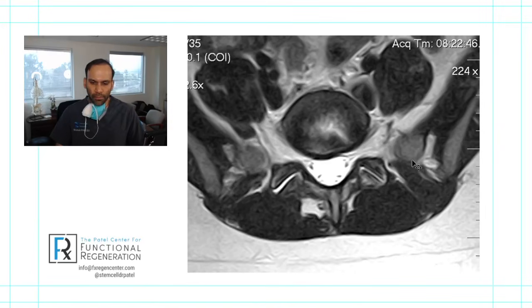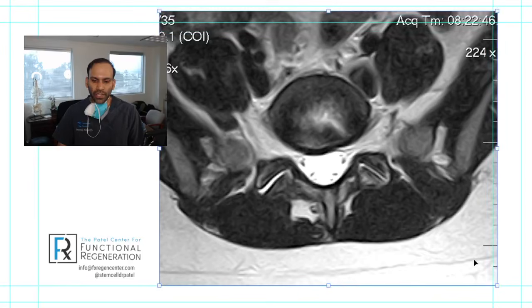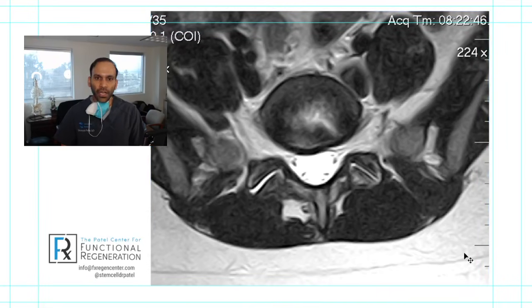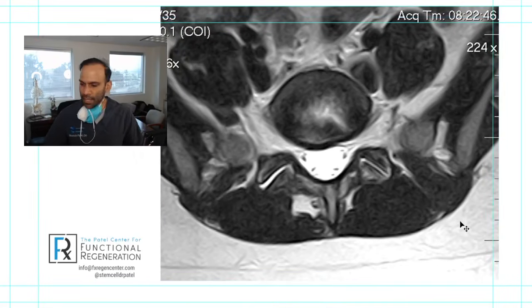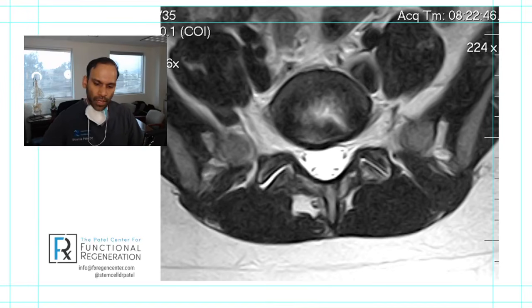So here's another example of some fluid inside the joints. Again, we don't know if this is or is not normal. For those of you that joined us last time, we could see a couple other things. All right, I'm back. We could see some other things here. I just want to point out we have our disc that has this kind of broad-based disc protrusion. And for those of us that were there last week, here's that tear inside the annulus, okay?